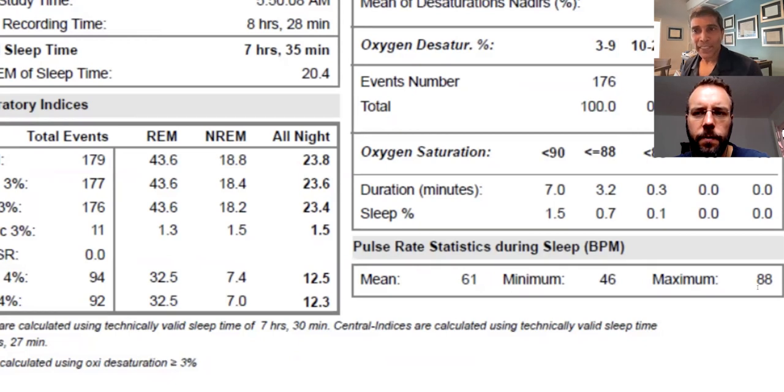If it goes up too high, I don't like it, but if it doesn't go up at all, I'm going to say, oh, well, you may have less heart rate variability. Does that make sense? Your cardiac system may not be able to, I guess, react to the stresses being presented to it. It looks more ominous now, doesn't it, Andrew?